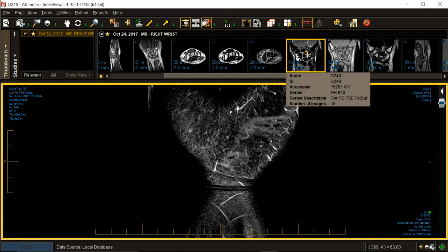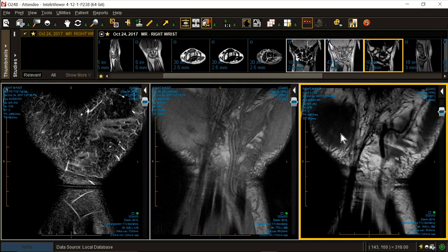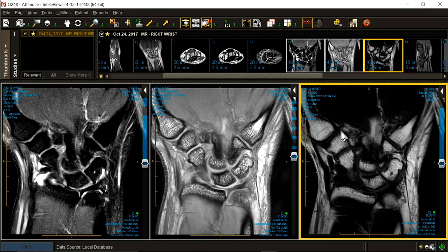Put up the coronals, but if I was by myself and I thought there was a mass, I'd go axial. There's no history of a mass. Broken finger, impact injury, pins removed, swelling, weakness. Evaluate TFCC, complex tear or ganglion.